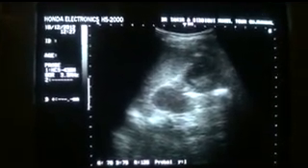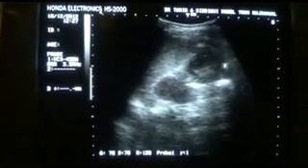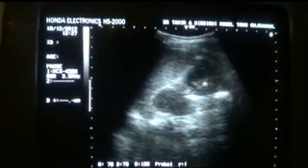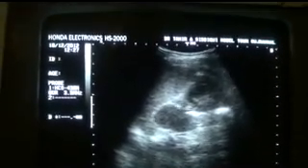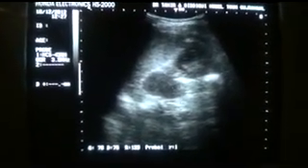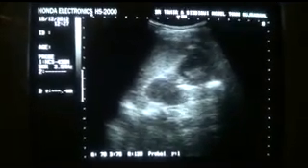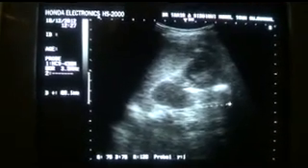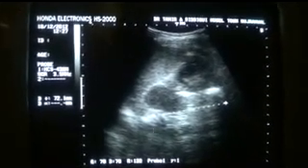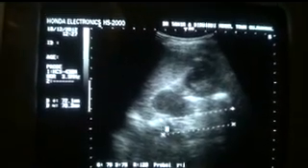See, this is the capsule of the kidney. This is the calculus in the renal pelvis. This is a well-demarcated cystic area with internal echogenic areas in it. This is another well-demarcated thin-walled hypoechoic area seen relating to the upper pole of the right kidney, and this strap of that you are seeing is the iliopsoas muscle. This is the iliopsoas muscle.